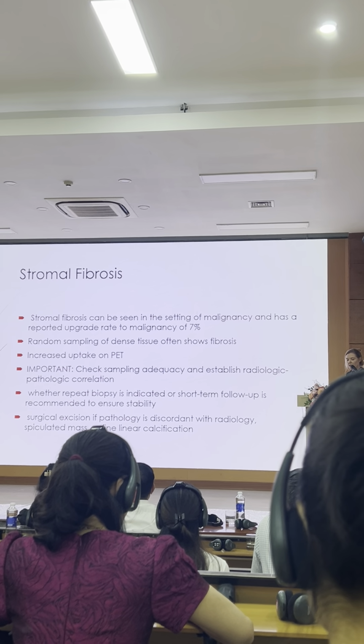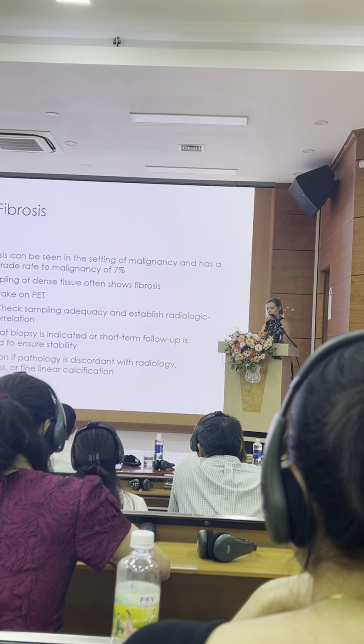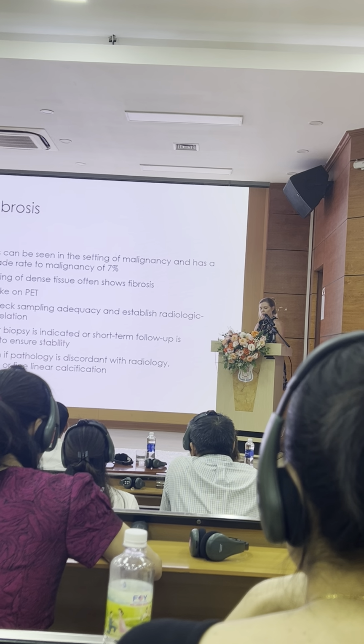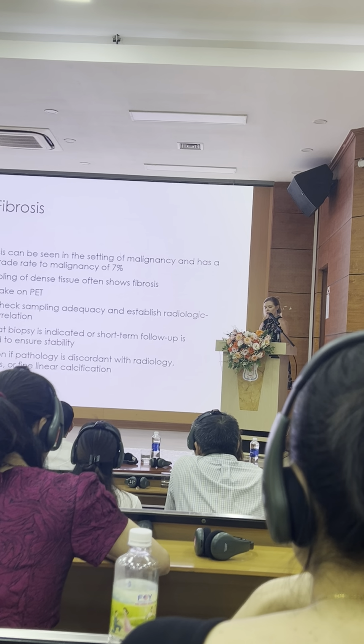That first case that I showed you, where it had that echogenic rim, we followed closely for a few years. Surgical excision is recommended if the pathology is discordant from the radiological findings, or if it's a spiculated mass or fine linear calcification.